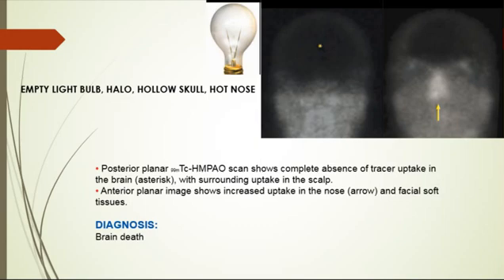giving us these signs. So in adults, a scalp band or tourniquet can be used to decrease scalp activity that might be confused with intracranial uptake. You know the skin will take the isotope. So they just put a rubber band or something on the scalp to decrease the uptake so that we can see the brain more obviously. Okay? If the patient's head is resting on a firm surface, a focal scalp compression may produce a photopenic defect known as the hollow sign. The patient's lying on a bed or table, the compression of the scalp posteriorly will give us what's called the hollow sign.